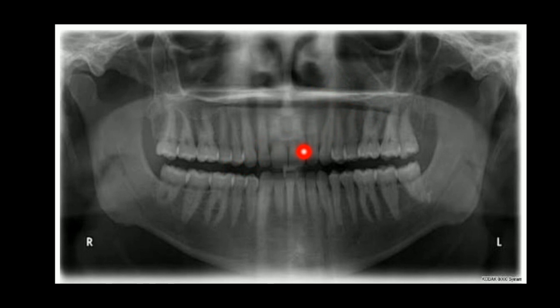Here, a crescent shaped radiolucent line can be seen, which is nothing but your lip line. And here you have, just behind the condylar process, the ear present. Okay, talking about the air spaces, we have three air spaces as a whole. Here, just behind the palate, we have got palatoglossal air space, continuing as the nasopharyngeal airspace, which further continues as glossopharyngeal airspace. So this is all about your landmarks of the OPG and the soft tissues, the bony landmarks, the soft tissues, and the airspaces.